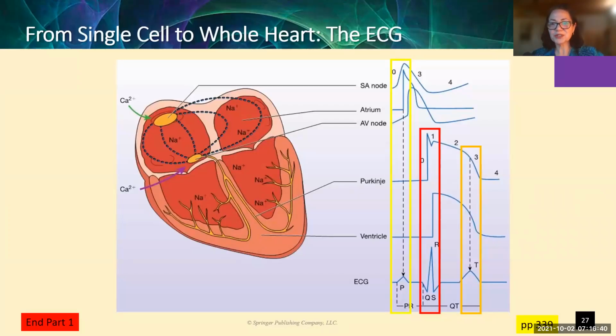Welcome back to part 2 of the chapter on the heart. The first part went long, so I was dramatic in cutting things for this second part. This will be briefer. We're going to examine some arrhythmias, departures from normal sinus rhythm.